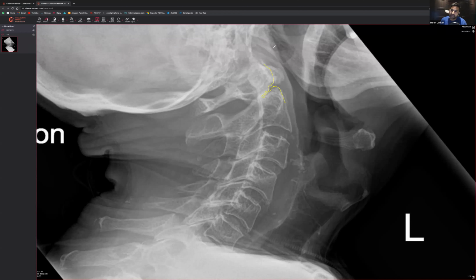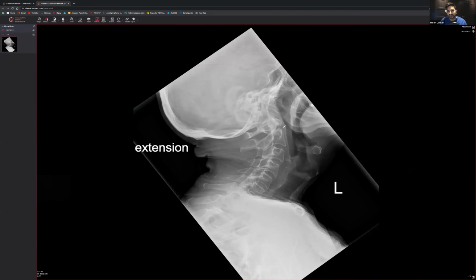What's even more unusual is that when someone's got a fracture like that, generally speaking, you have a lot of soft tissue swelling. That's the soft tissue, but this doesn't look like there's much swelling. So you wonder whether they've had a fracture for a while, and it looks a bit radiolucent, a bit jaggedy edged. If it had just happened right there and then, you'd be expecting a lot of soft tissue swelling. But in this situation, you don't see much in the way of soft tissue swelling. In fact, you just see what looks like a discrepancy there.